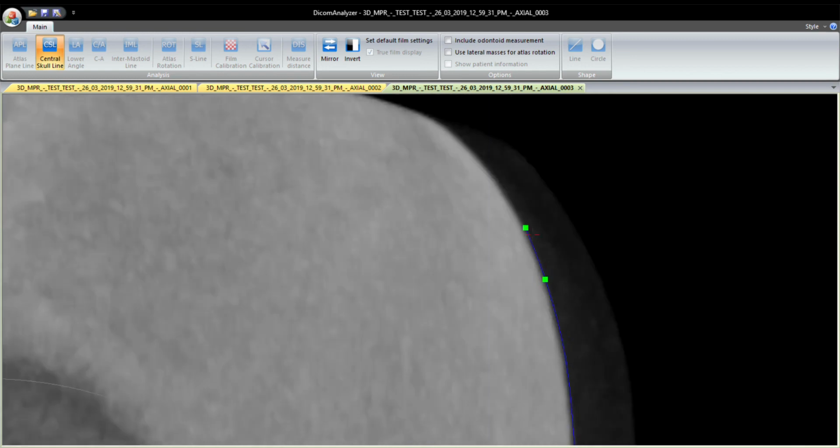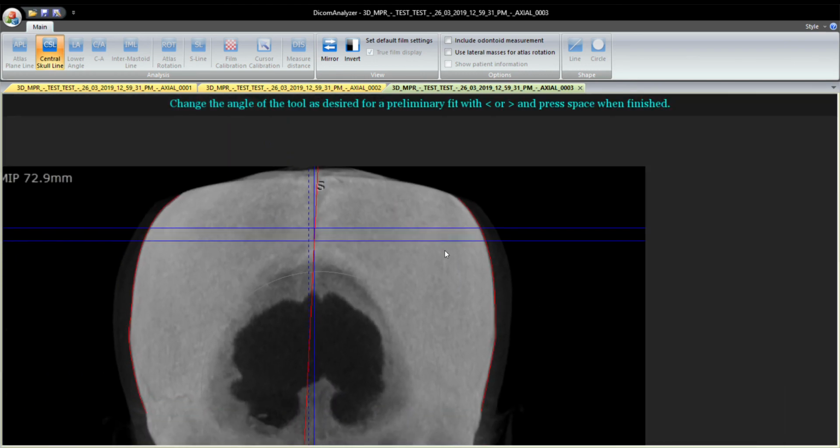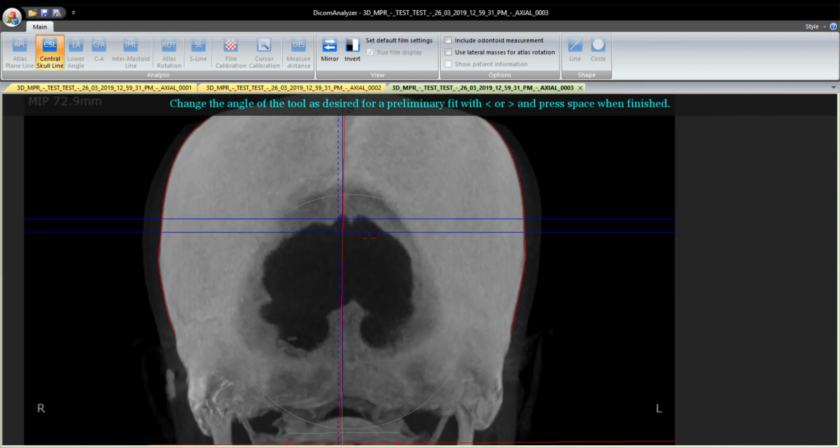And these points here can be as close or as far apart as you want. Usually I just get them to where I can find it most accurately hits the edge of the skull. And as you come out, we don't have a cephalometer tool that overlays because that does math and the computer's good at doing math. So instead you have two parallel lines that are about 1/4 inch apart. They identify the range of the skull you're looking at.